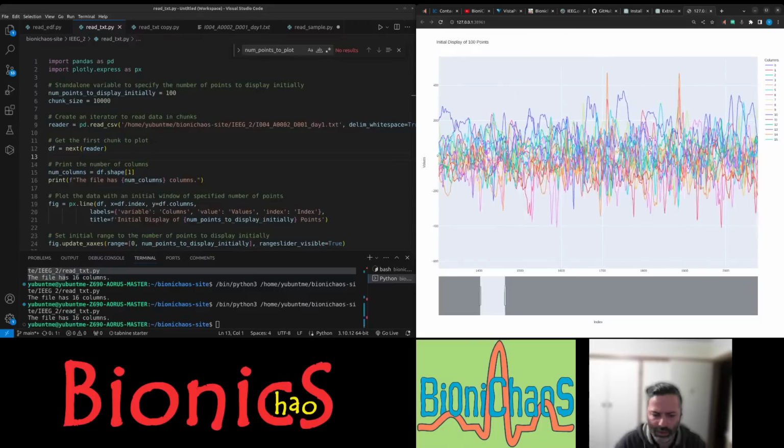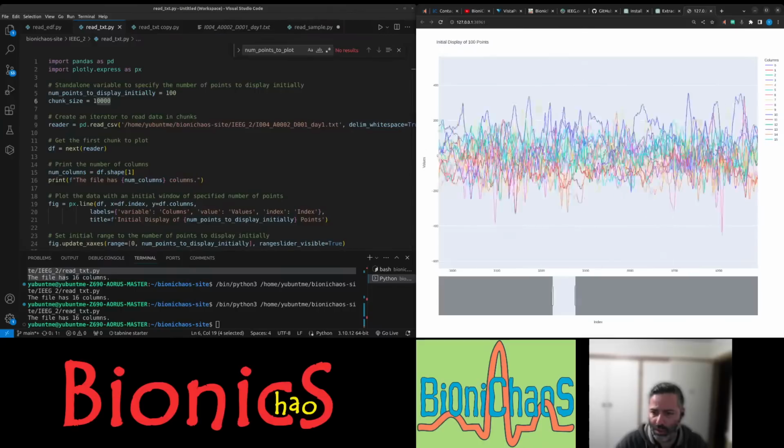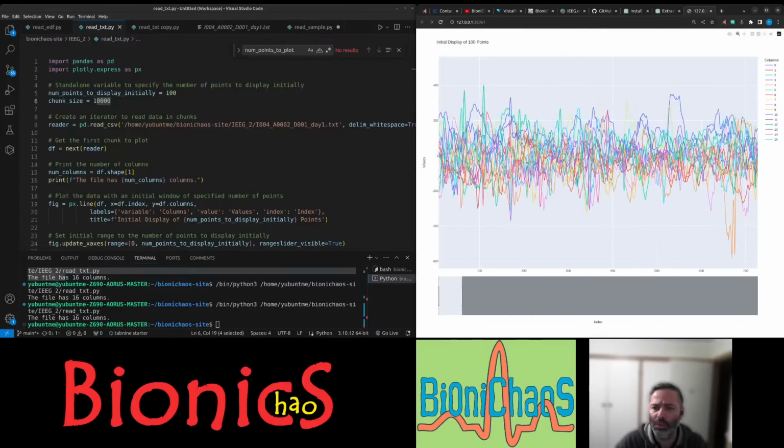We've got this tool that GPT-4 made for us in pretty much no time. So we're loading 10,000 data points from this file. Sorry, my voice is super annoying, but it is what it is. We want to make sure we're loading the correct data.